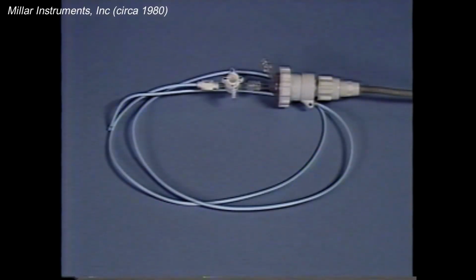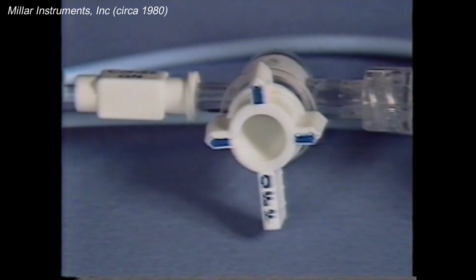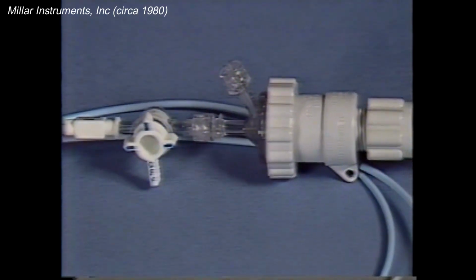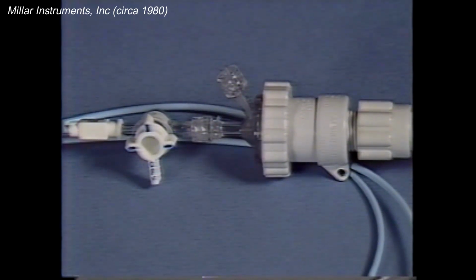The next element of significance to affect the accuracy of pressure measurement in a fluid-filled catheter system is the external pressure transducer. It should have a high natural frequency, low volume displacement, and a structure that facilitates the removal or elimination of any trapped air bubbles within the fluid system.